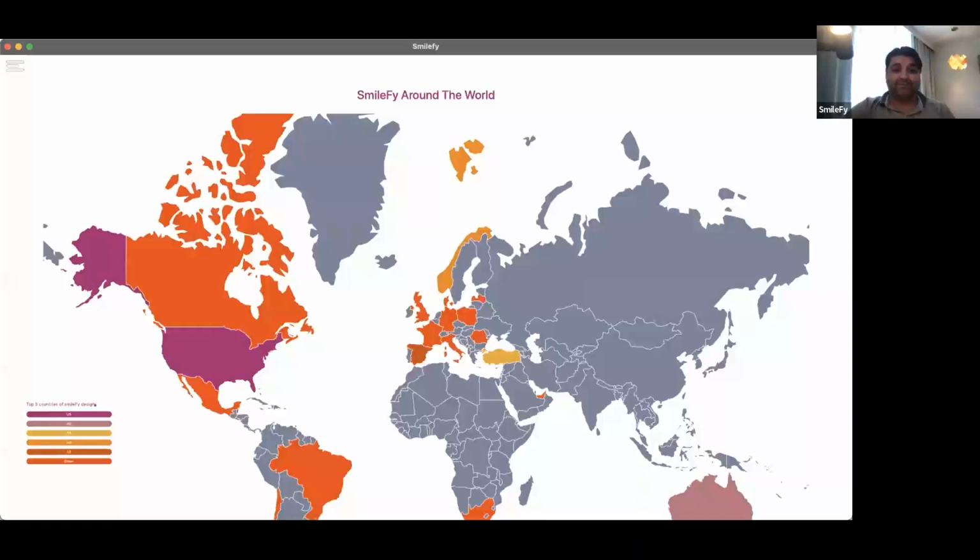Welcome, and I'm going to introduce you to Smile Design, the next generation, a completely different approach and a completely different idea: how to motivate the patient, how to take the digital records of the patient, and then how to create a real clinical diagnostic project using Smilefy as a platform, with edge technology and new, unique workflows. I hope you enjoy it and gain a lot of value using our new vision for aesthetic treatment.